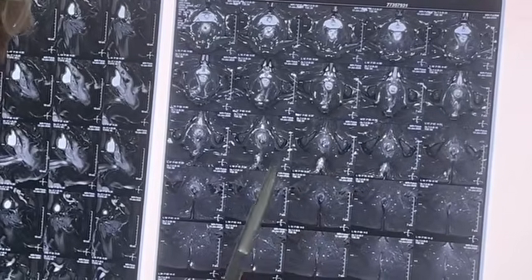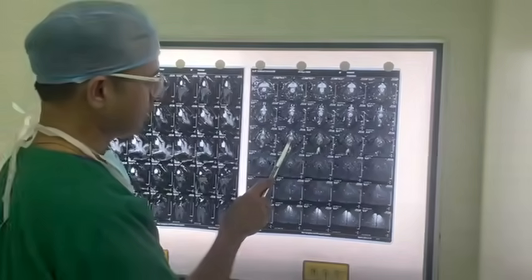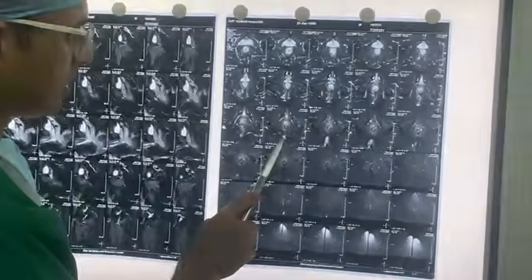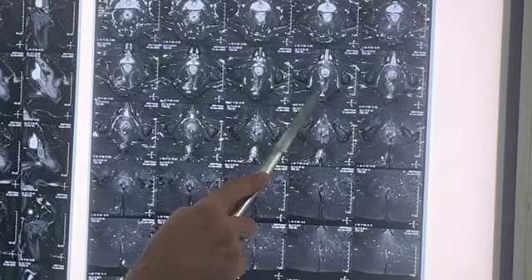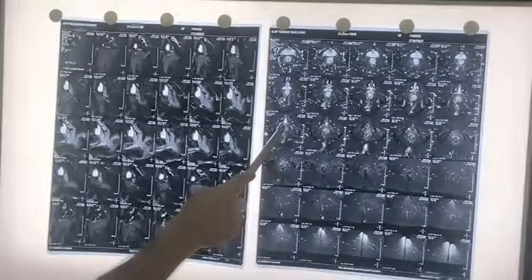This is a posterior high transsphincteric fistula starting at a 6 o'clock position, going into the tip of the coccyx, and it is below the anococcygeal ligament. This is the deep postanal space. It is connected. We can appreciate it in the sagittal section.